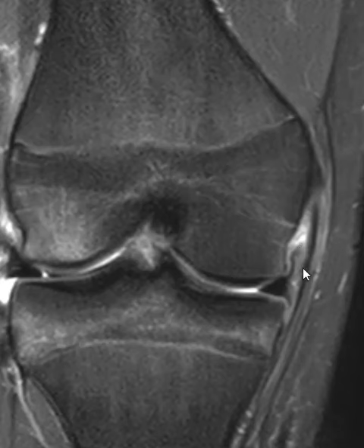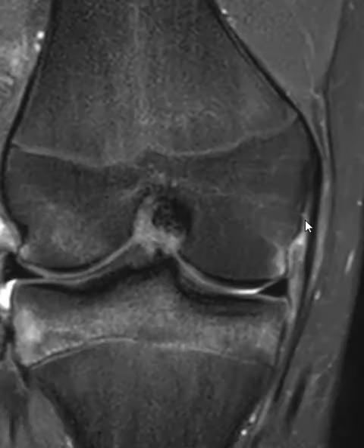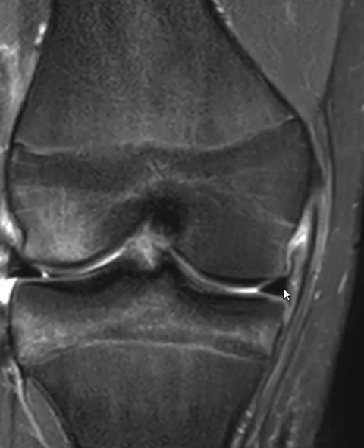So this is a tear involving the inner capsular fibers of the MCL from the femoral attachment here, and again, the component to the meniscus body is still intact. This patient incidentally had an ACL tear and typical bone contusions, a little radial tear of their lateral meniscus here. And that's it. Thank you very much.